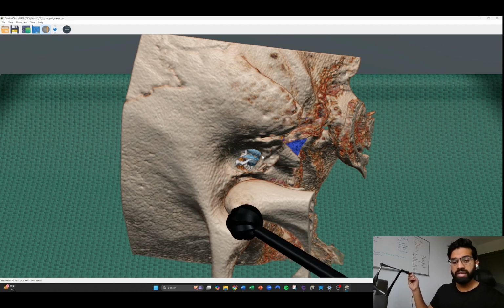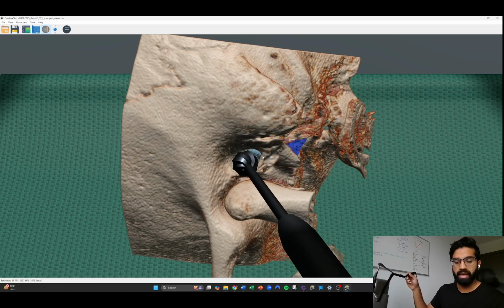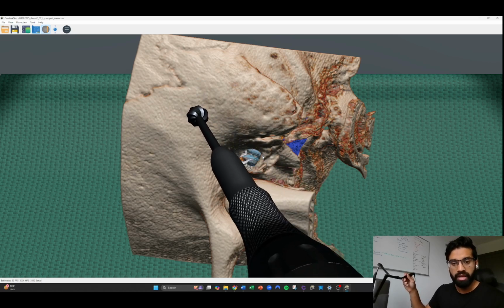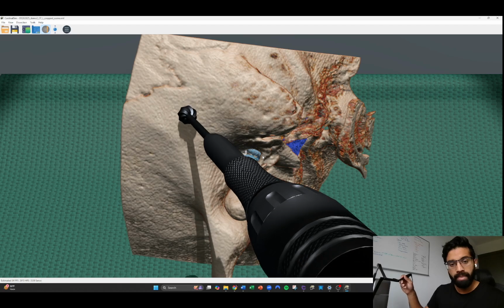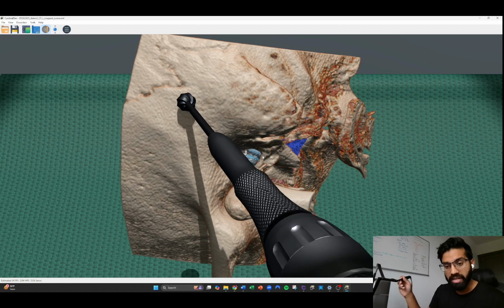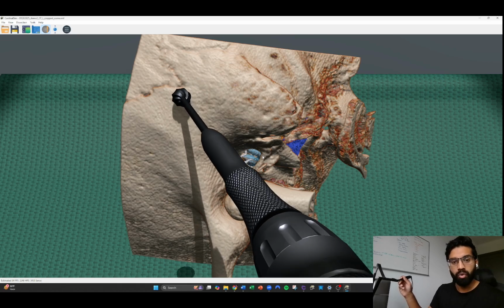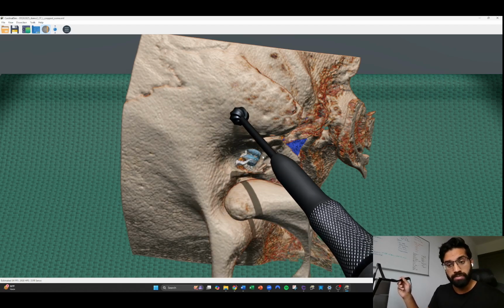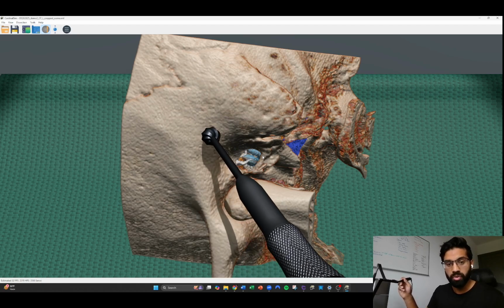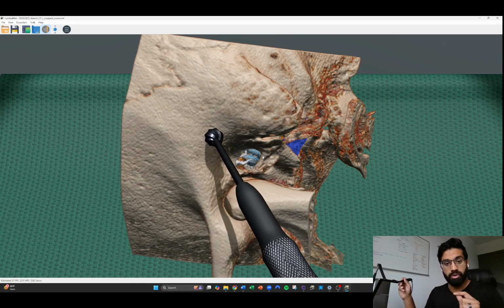software. So whenever I put the drill out here, it just feels like I'm moving my handle in my hand around in space. But as I push my handle towards the screen and my drill goes towards the bone, when I make contact, I physically cannot push this any further. I am experiencing forces in my hand that correlate to what a surgeon would experience if they were to push a surgical drill into this particular patient's bone and their particular bone density.